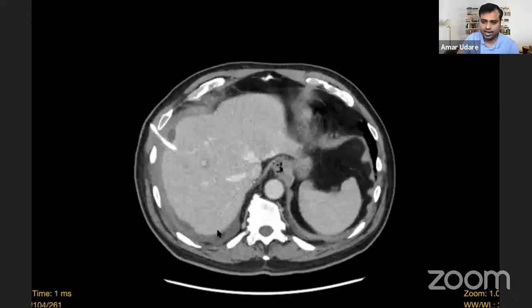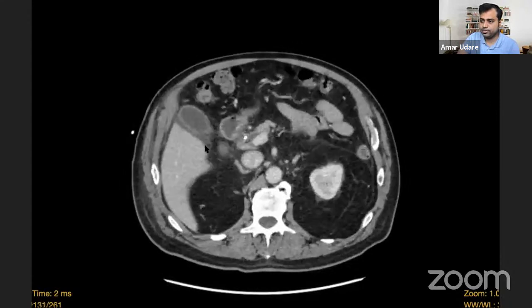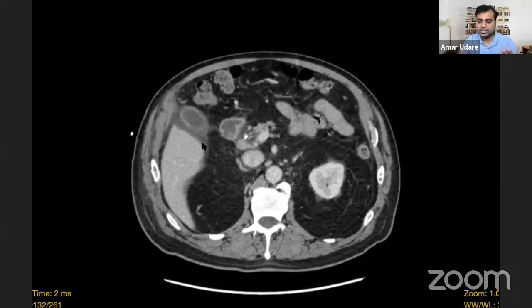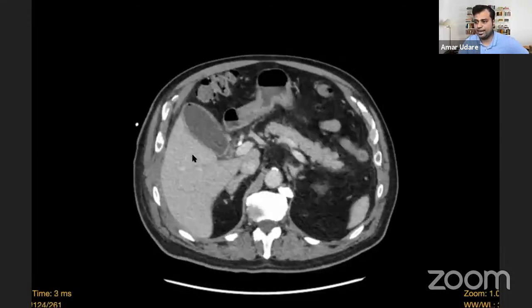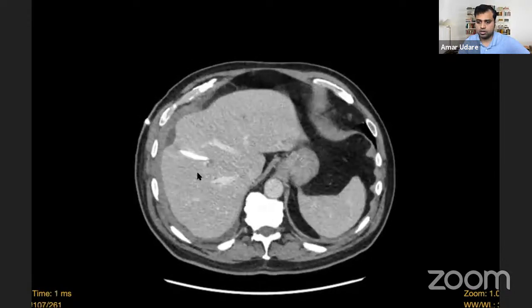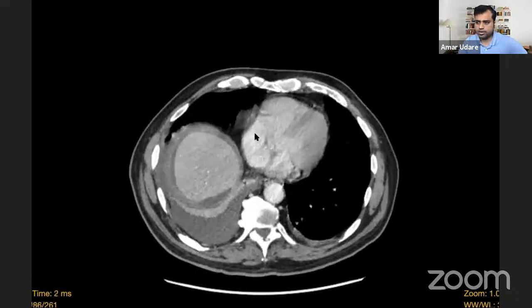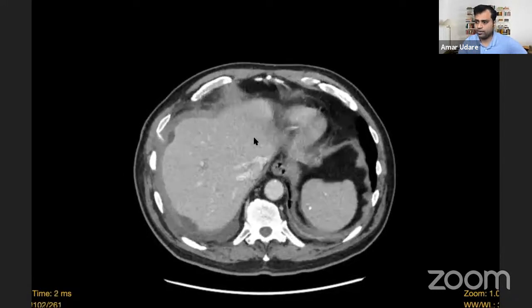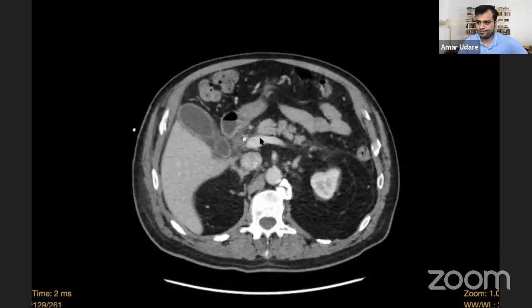There's another finding, cholecystitis. Prakash, as we discussed, because this patient underwent a procedure, this is all probably secondary to just the procedure and unlikely to be acute cholecystitis. Right pleural effusion, that's a good thought. I'm not sure whether the patient was female or male, but that's not relevant in this case.